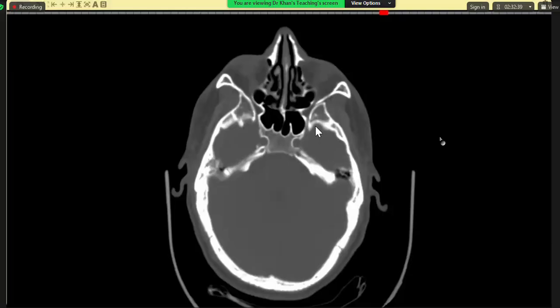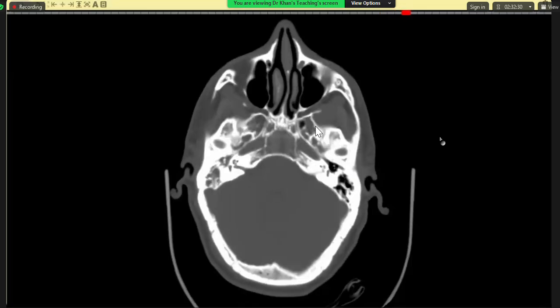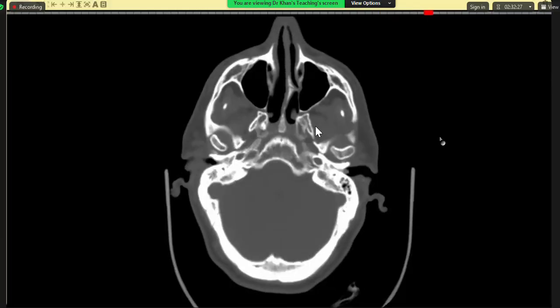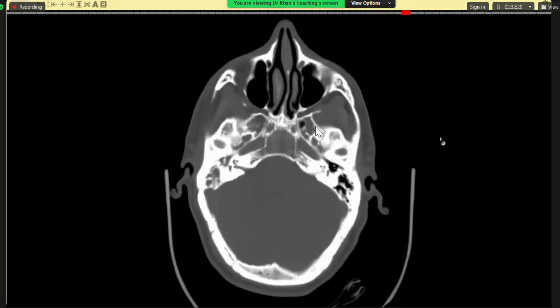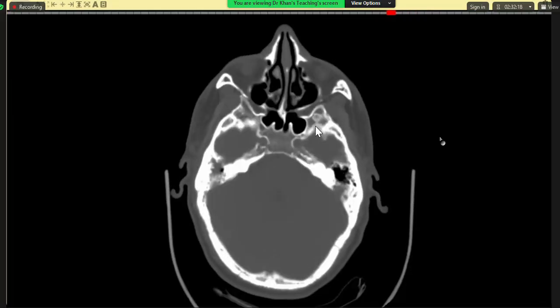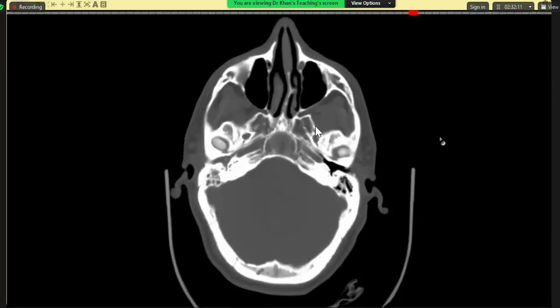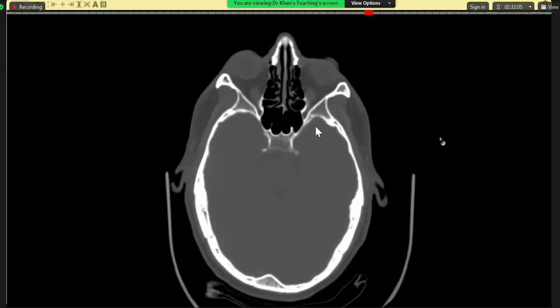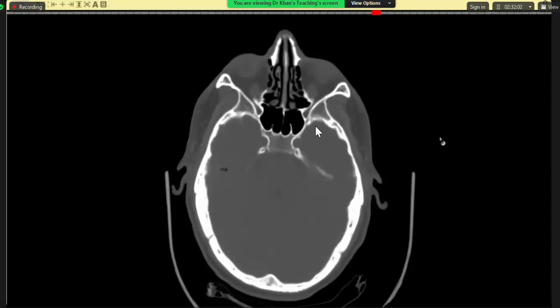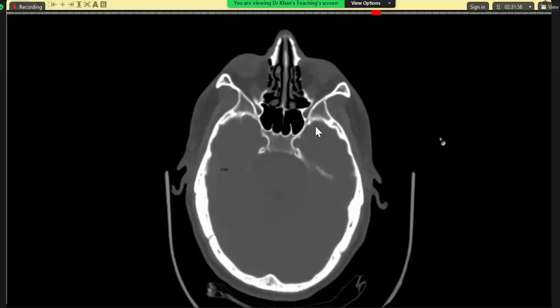Okay, in the bone window, I'm going to see the region of temporal bone because I observed hyperdensity in the region of sigmoid and transverse sinus. So in the region, there is a soft tissue density completely opacifying the middle ear cavity as well as its posterior part. Mastoids are hazy and completely opacified. There is some air foci seen within the intracranial cavity as well, which is consistent with the air fluid level which I saw at the same region.